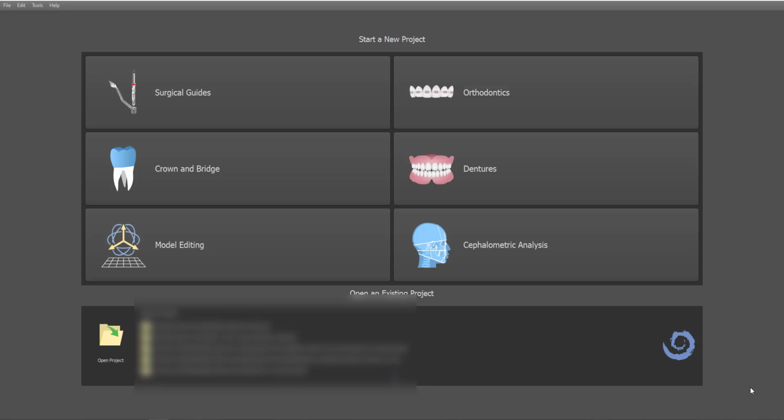Hey, this is Dr. Corey Glenn with Blue Sky Bio, and in this video I'm going to show how to do a true crown down implant planning.